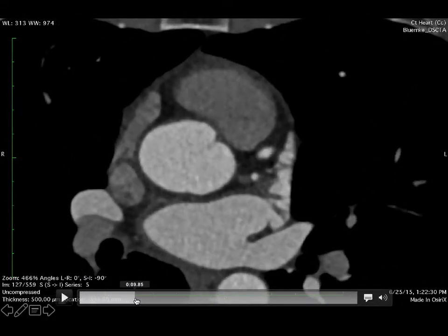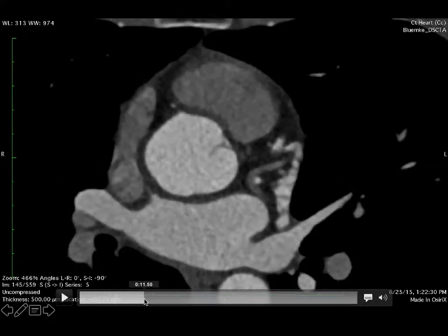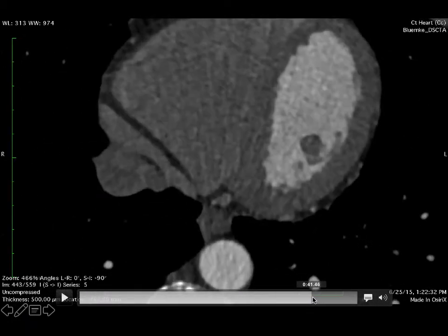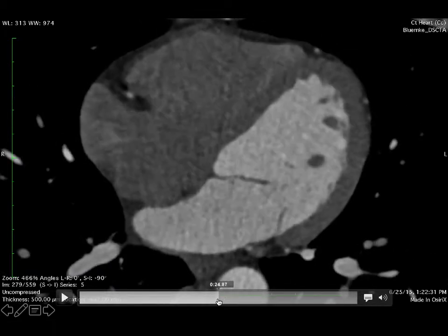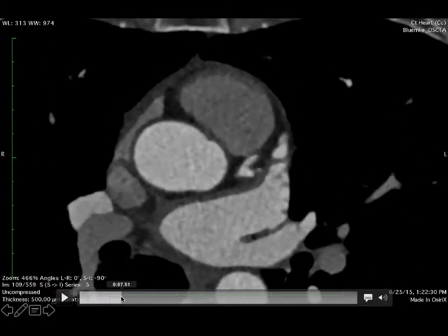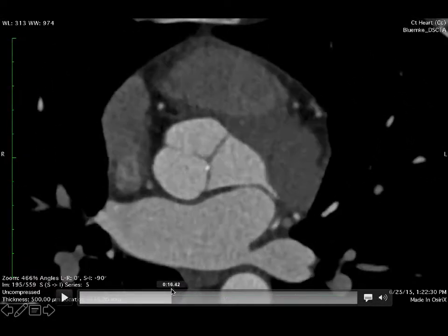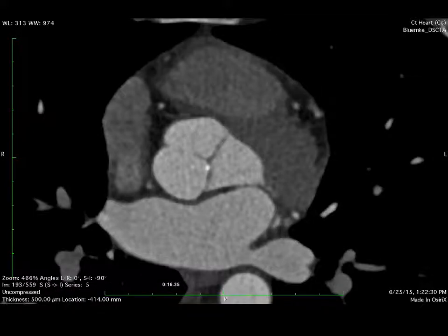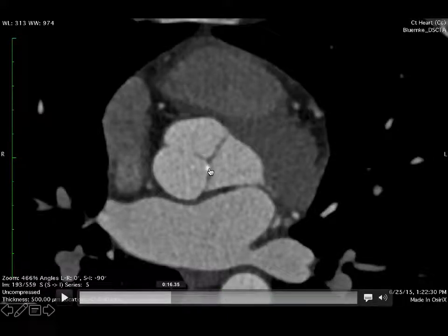This is an image from a standard modern-day Siemens scanner of someone who is absolutely normal. This is a 55-year-old person. And you can see some of the features in this scan. So the aortic valve leaflets are very well resolved. They're less than a millimeter, right? But they'll be blurred out to about a millimeter here. There's a little chunk of calcium on this aortic valve leaflet that is observable with this technology that you wouldn't see with others.